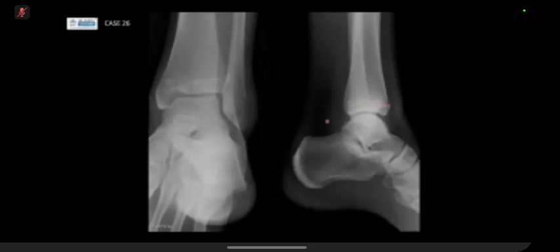And then if I take a look again, thinking, okay, is this a fracture? There is a lucency that's just behind this at the tibial epiphysis. And if I give an additional history that the child is probably 14 or 15, a boy, or 12 to 13 when you're a girl, and that's when your epiphysis starts to close, then you're thinking of ankle fractures that are specific to the closing epiphysis, okay? And you can see here it's a little bit wider on the lateral side and a bit more fused on the medial side. So this is a Tillaux fracture.